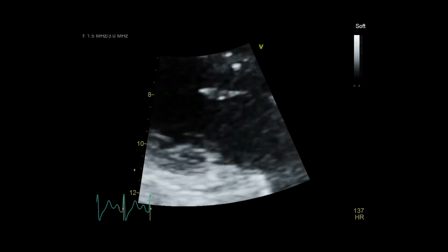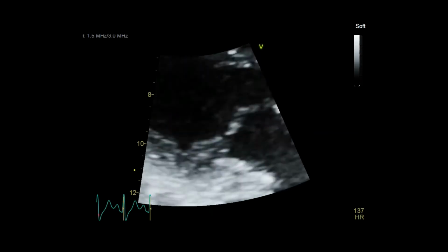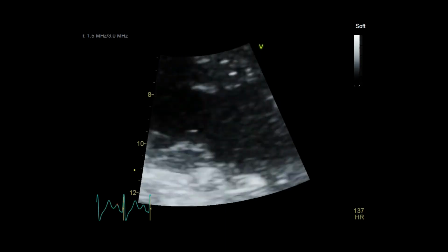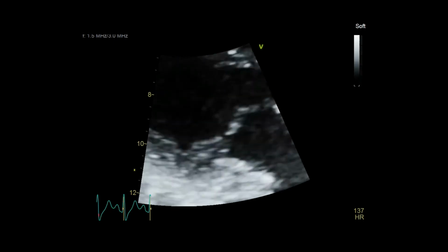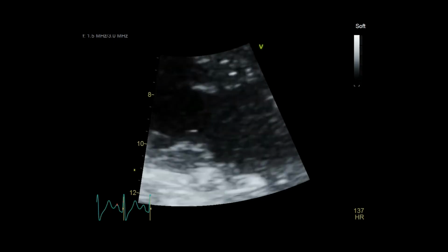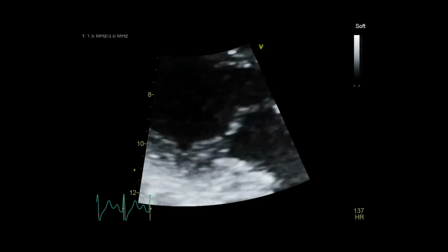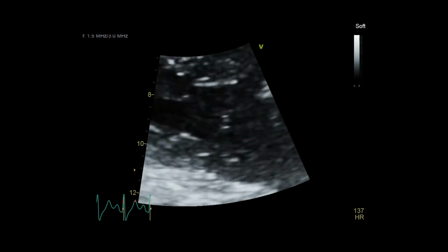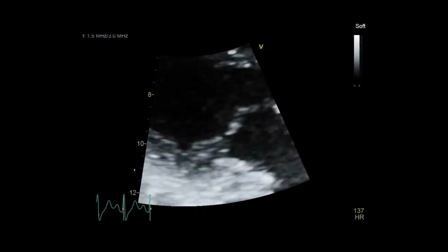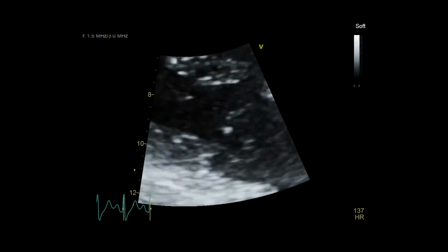And this is another example of an abnormal mitral valve. It's tricky to see because it's so fast, and I'm sorry I can't slow it down. But these leaflets are hypermobile, so they're too mobile, and you can see some part of probably the posterior leaflet, but again, it's hard to tell, prolapsing significantly back into the left atrium. And in fact, this would indicate a flail.